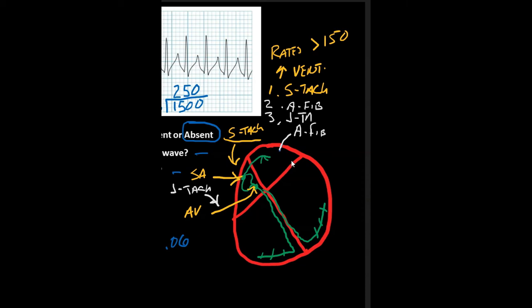Okay, so this junctional tach can be one of those other issues. I'll move the other ones over here in a minute. So keep in mind, the other thing with junctional tachs or any junctional rhythm is that if it has a narrow QRS complex like this, it just kind of does one of these. The other thing that it could do is have an inverted P wave and do something like that. So it could have that inverted P wave. Move those out of the way for right now.